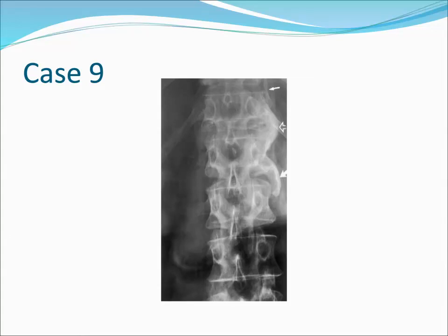This patient has large non-marginal asymmetric syndesmophytes, which are typical of psoriatic arthritis or Reiter's syndrome. This patient indeed has psoriasis. A syndesmophyte is a paravertebral ossification that resembles an osteophyte except that it runs vertically, whereas an osteophyte has its orientation in a horizontal axis. Sometimes deciding whether a particular paravertebral ossification is an osteophyte or a syndesmophyte is difficult based on its orientation alone.